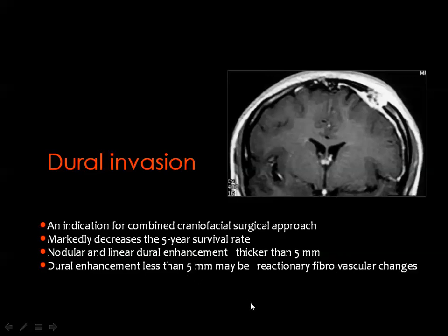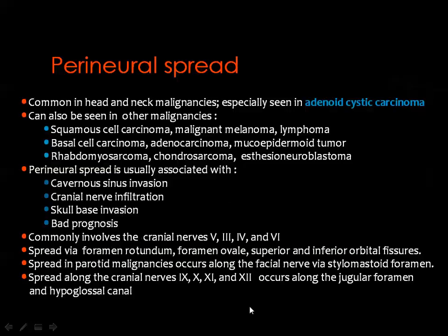If there is dural enhancement of less than 5 millimeters in thickness, this may not represent dural invasion, but maybe a reaction to the contact of the tumor to the dura.